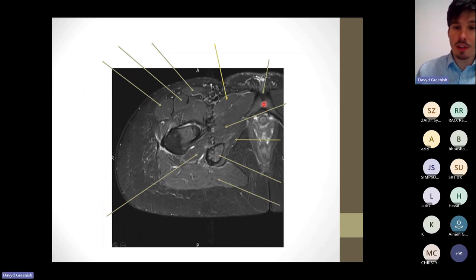We're a little bit lower down now. We know that we're lower down. We've got the structure here between the two pubic bones, and we've got another bone here. We're just going to go through a few of these. I'm going to start centrally and try to work our way around. We've come a bit lower down. Does anyone know what this structure here is?